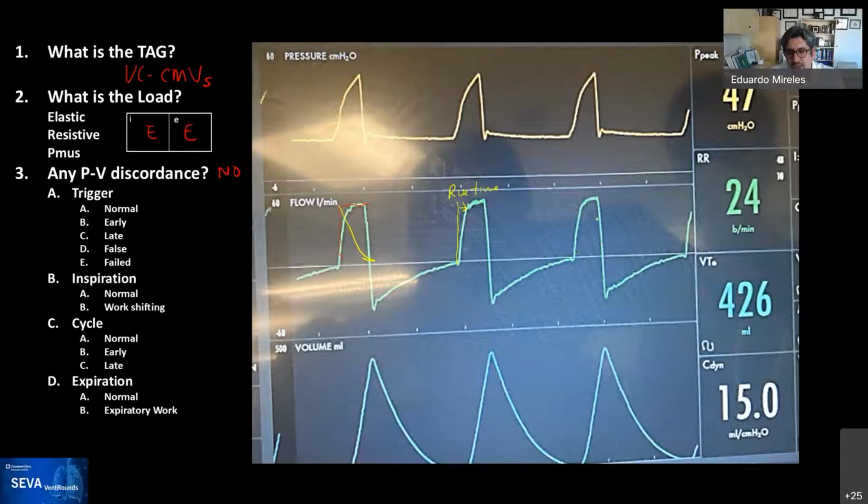So essentially, instead of choosing like in other ventilators, where you choose either a square or a ramp, in this ventilator you choose the value at which this is going to end. So it may peak and then end up here at 40%, or you can put it to 0, or you can put it to 50, whatever number you want. What's the use of that? Beats me. It has no clinical use.